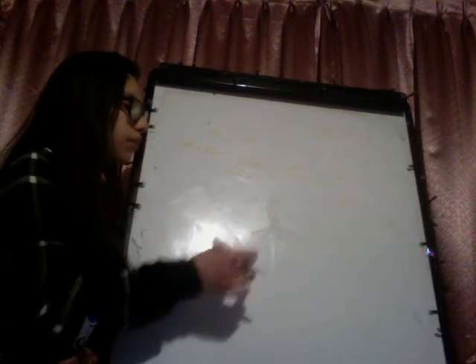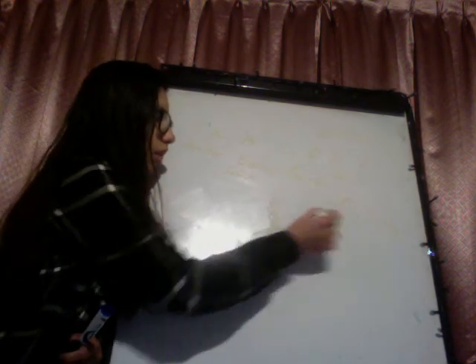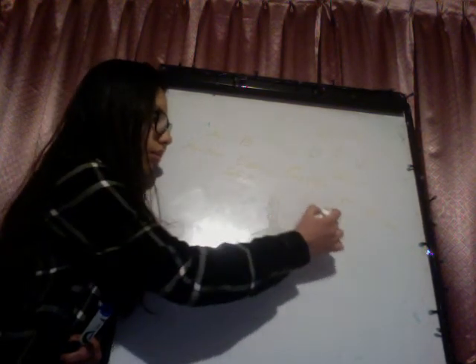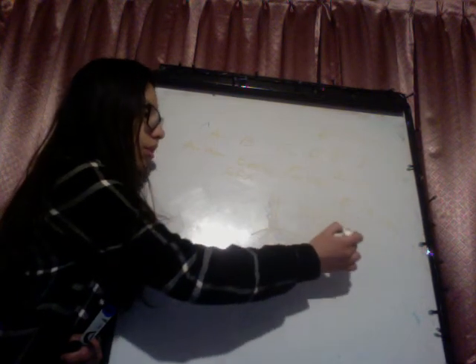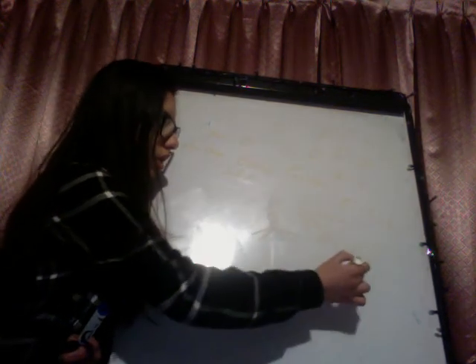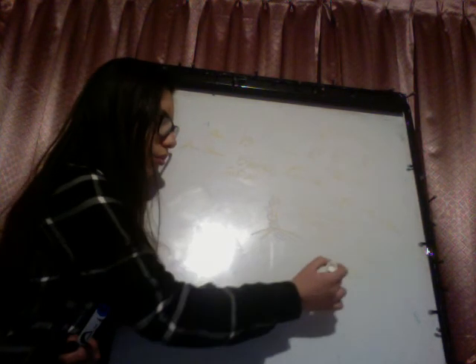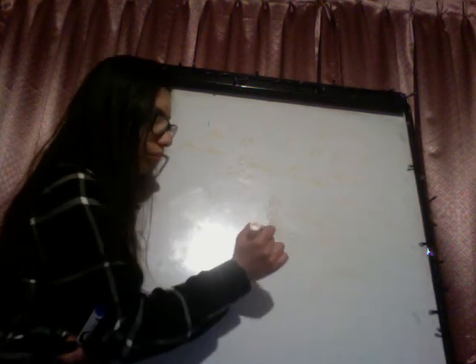The B stands for bones. We have the clavicle, ribs. It looks like this. This will be posterior, and this will be anterior rib. Then we will have the sternum in a lateral view. This will be the head, this will be the body.